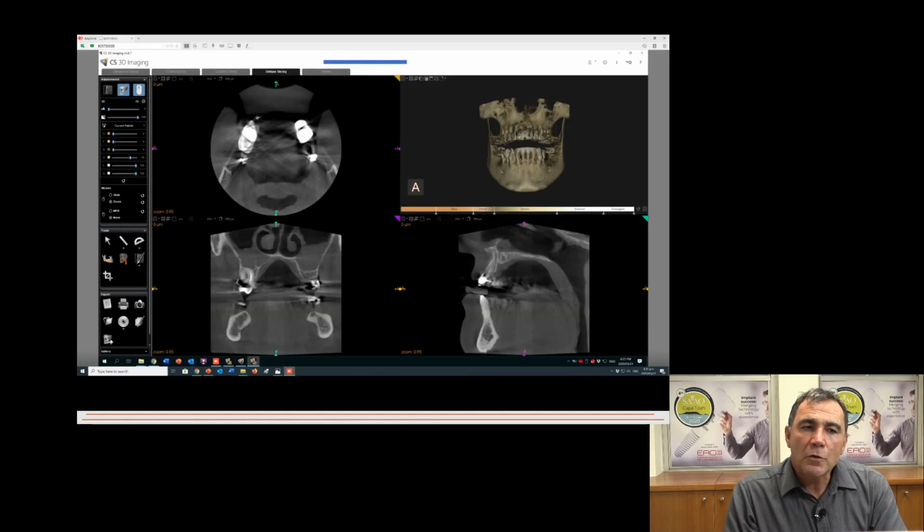And this is what it looks like after you've opened it from your CD and it is on your monitor. If I could choose 4 factors to show you what to look for when you get this image, this is the following. The first is you must know how to enlarge a specific field. So there's the button where you can enlarge the field. You must also know what the mouse can do. The mouse can enlarge it or you can slide through it.